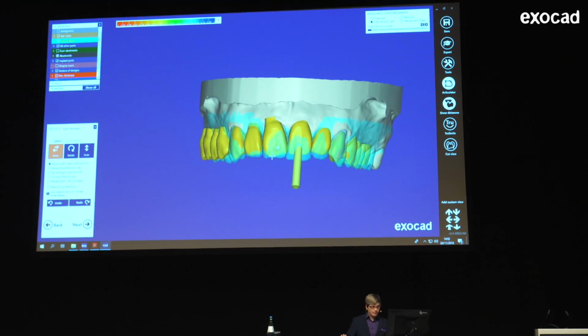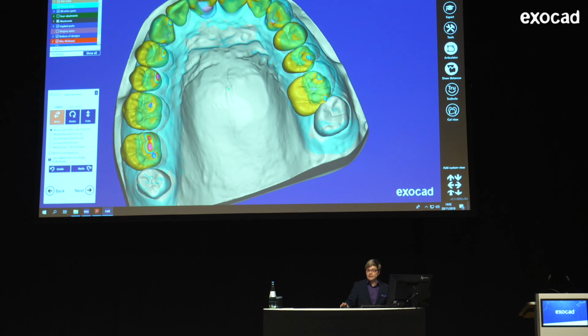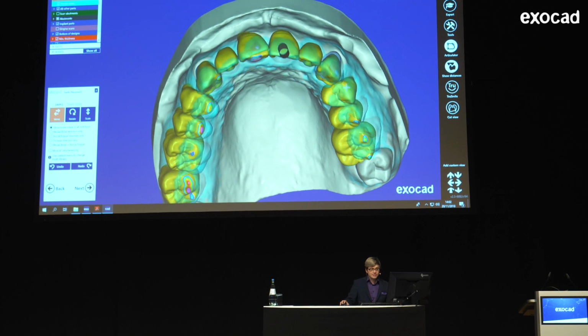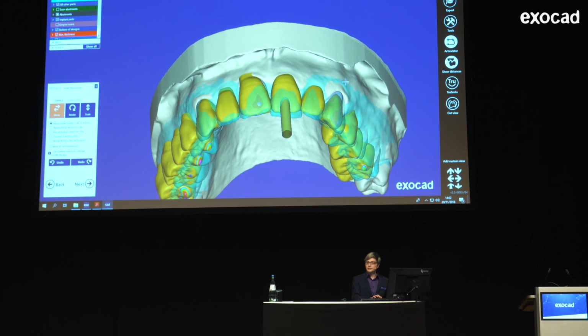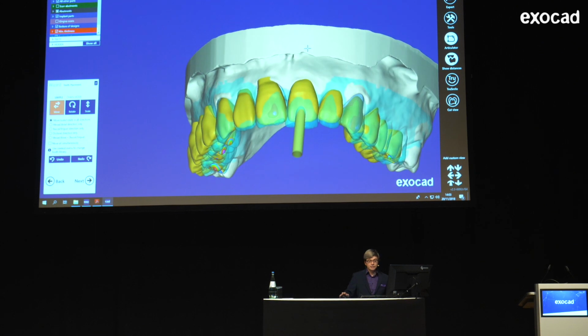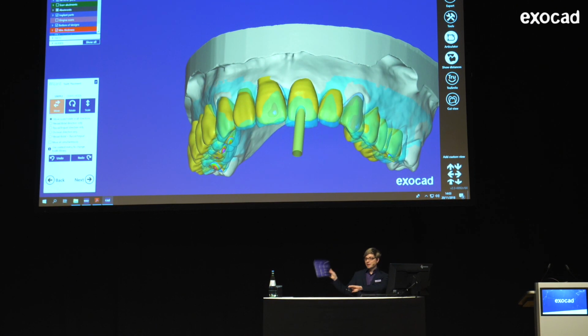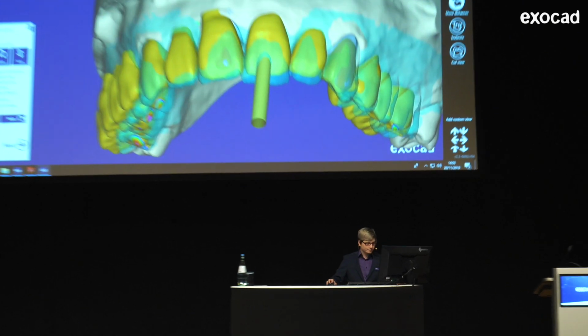And now, as you might know, we have entered some new hotkeys in the Valletta version. They're obviously still there in the Matera version. So when I press Shift and P, I can just activate the transparency of, in this case, the pre-op model. If you're ever wondering which key corresponds to which model, we have, on one hand, those mouse pads you may have seen already. On the other hand, you can just go over here and look at the tooltip and see there it says hotkey P for pre-op in that case.